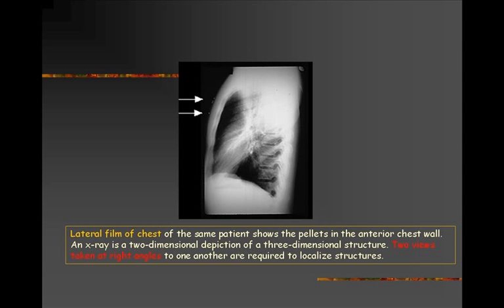Two views taken at right angles to each other, looked at together, give us the three-dimensional orientation needed. Always think 3D. Let us look at another clinical case.